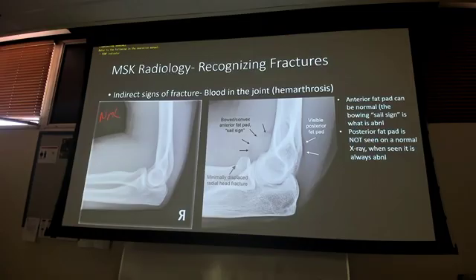And the reason is there is bleeding in the elbow joint and there's not a lot of area for that blood to go. There's some small bleeding, likely from a radial head fracture. You can see how small that fracture is in the black arrow on the radial head there, right? But it bleeds, and it doesn't take much blood to put a little bit of pressure on that fat pad to make it stick out a little bit and become present on an x-ray.